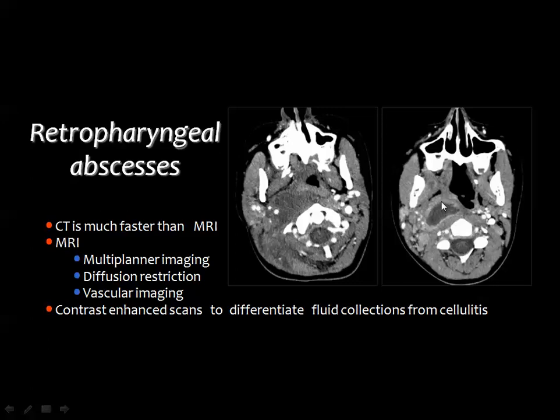And here you can see a retropharyngeal abscess showing the classic criteria of a cystic lesion, hypodense with a thick enhancing margin, and the related soft tissues are swollen with obliteration of the fat planes. Then you can compare these changes with the opposite normal side. You see the fat planes, and you can easily separate the muscles from each other.